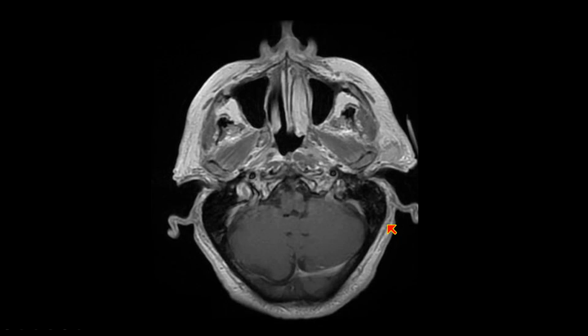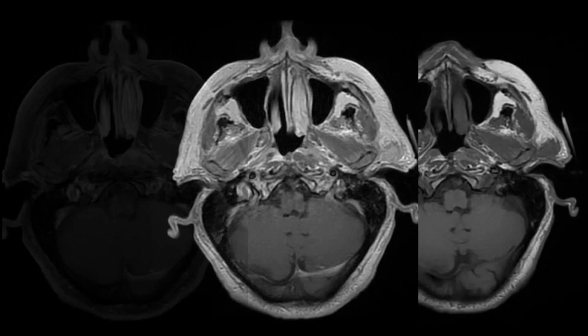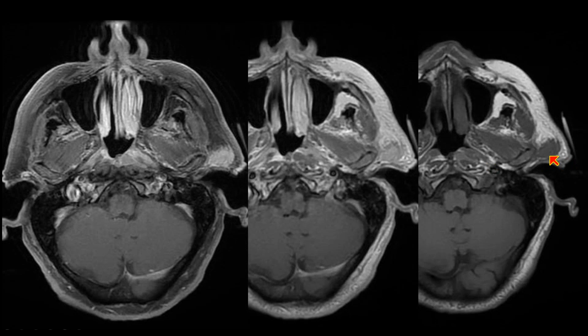Here's another case where on the post-contrasted imaging without fat saturation, it's hard to see a specific lesion anywhere, but that lesion is pretty obvious if we look at the pre-contrasted T1 to see this preauricular mass, or if we do our post-contrasted with fat saturation. We want to be very wary of lesions that may enhance to the same degree as the surrounding tissues, or that may look a lot like fat on the post-contrasted imaging. So it's much easier to see this lesion on the post-contrasted with fat saturation, or here before we even give contrast, on the pre-contrasted T1.